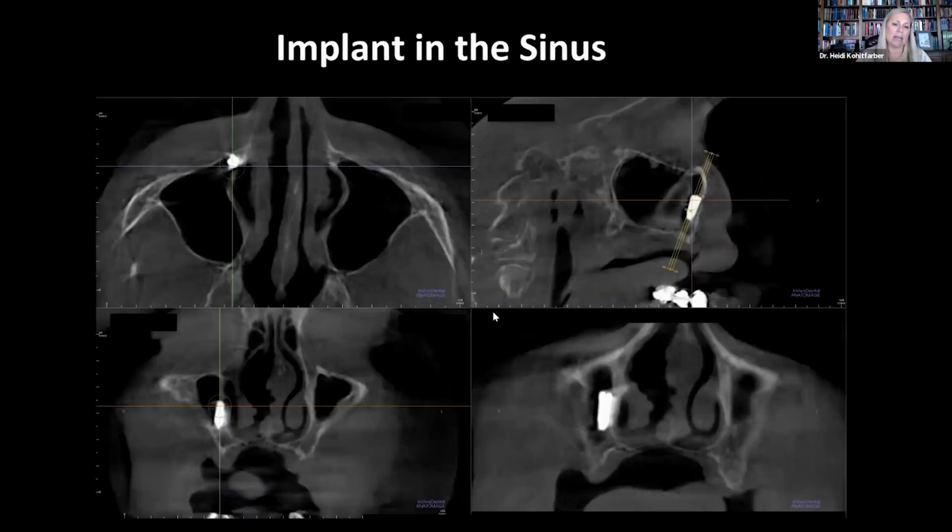This patient had a history of a failed implant and was new to this office. They went ahead and took the CBCT and they found the implant. So where is it actually? Well, it's osseointegrated. About 90 or 95% of our implants are going to osseointegrate wherever they're at. So this is osseointegrated along the lateral cortical border of the nasal fossa, where it will live out its lifetime.